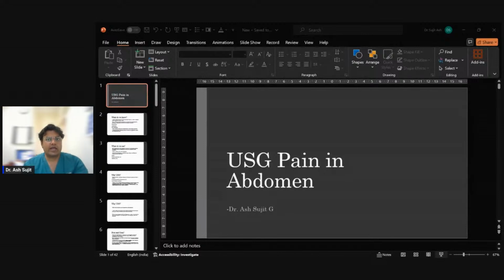Inflamed ovary can also be attached to the tube and therefore lead to a mass, which is called a TO complex, the tubo-ovarian complex. Persistent untreated disease can lead to disruption of the normal anatomy. There might be leakage which can happen. There can be a formation of an abscess, and this can lead to formation of a complex mixed solid cystic appearance in the pelvis.